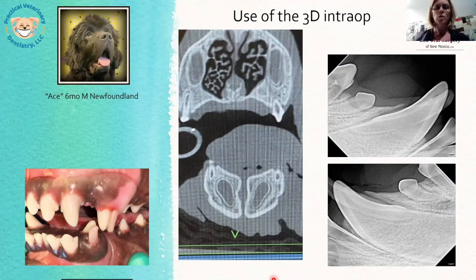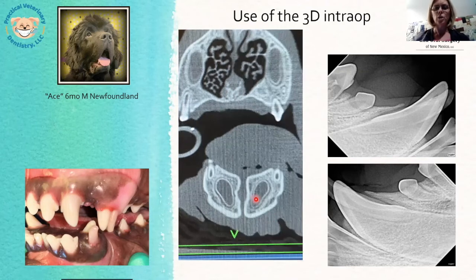And of course, as you look at this, you can also really appreciate the eggshell effect of the permanent tooth, how thin that tooth is in comparison. So being able to be prepared for that baby tooth to break in that spot, or try to prevent it from happening, by making a flap and doing your surgical access a little bit differently, you can get past that fracture point so that you can get the entire tooth out in that situation.